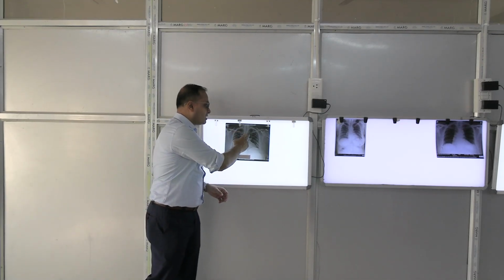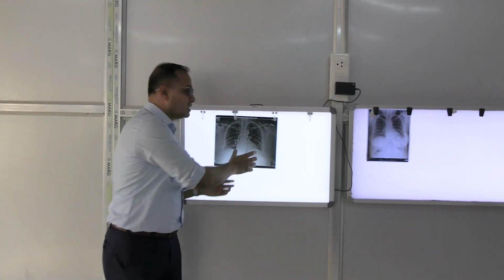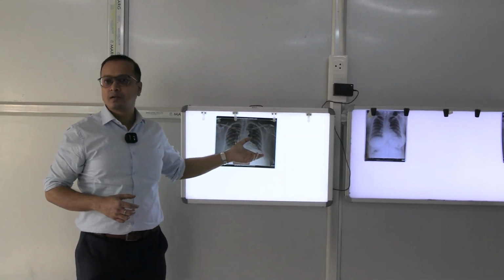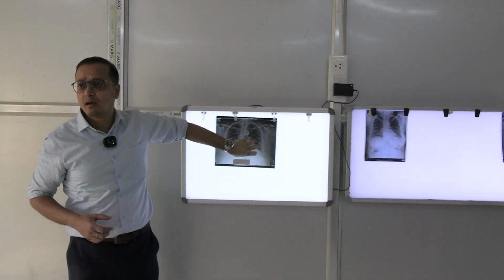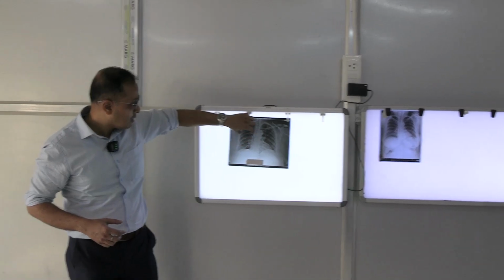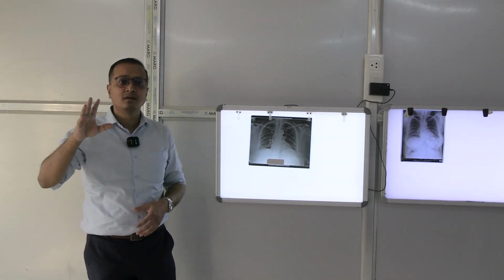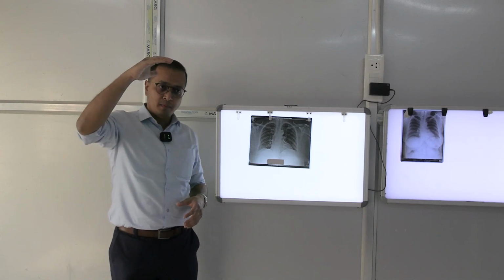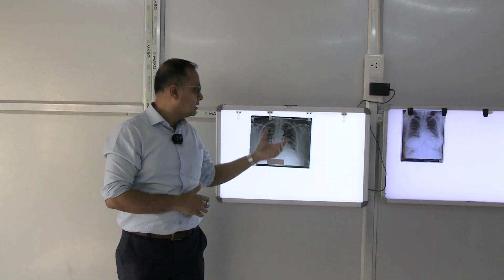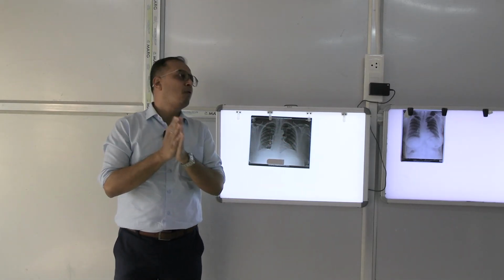Coming to the mediastinal shadows, as they come down, this region takes a silhouette principally from the presence of the heart, or heart shadows. So, these heart shadows will be present here, and you have to trace them. Once you are done with the lung shadows, in the heart shadows you have to trace three things. Just like in the lung, where we trace the apex, the base, the mediastinal margins and the angles, in the case of the heart as well we trace three elements. We call them the borders of the heart.